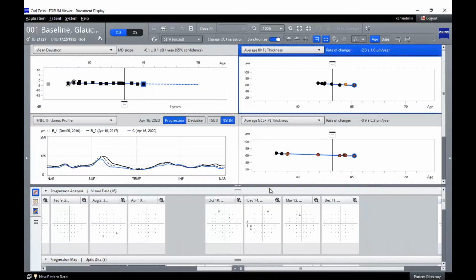Yeah. And Aaron, one thing that you can see here as well is how the RNFL thickness profile has changed, so that you're not getting those reds or the yellows. So yeah, as you reset the baseline, there you go. That was the first thing I noticed when you went back to this, Aaron, is that those areas of red that we had on our instant plot just went away. So you've definitely made a difference in this patient's progression rate.